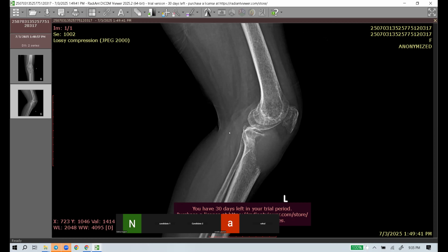So any other differentials? Lymphoma of the bone also can present with similar appearance, but unlikely in the appendicular skeleton. Usually occurs in the pelvis. We can see a large lytic lesion in an elderly patient. Lymphoma can present like this.